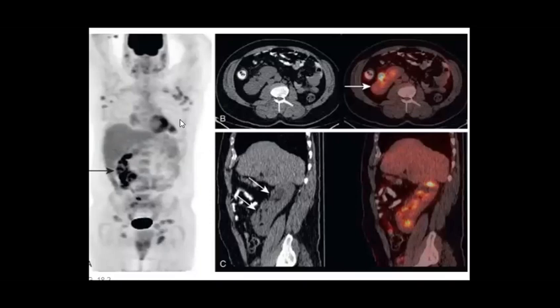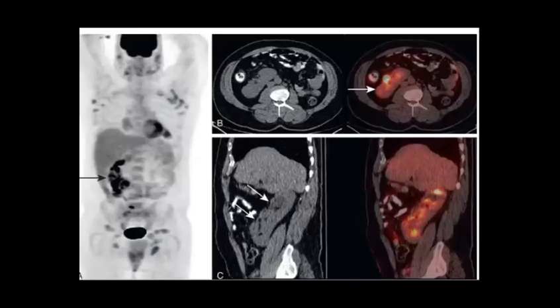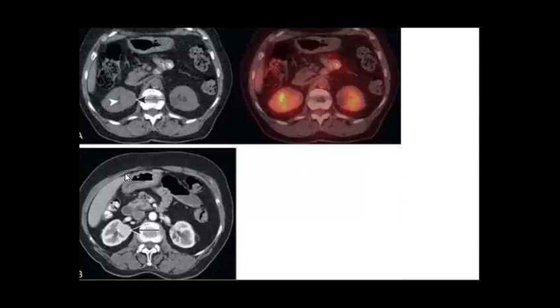Then when you find this, the patient already has something. Yes, Ala, perfect. This patient has lymphadenopathy, axillary and inguinal. So already this patient has lymphadenopathy, and one of the most common causes will be lymphoma. So this patient is a lymphoma patient, but already has another anomaly, which is incidental. Okay, let's have a look at this case.